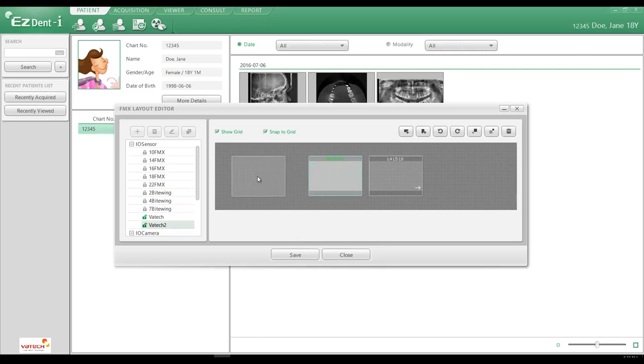From here we can now go ahead and modify this by left clicking and moving these frames to our new location, and then add 2 vertical PAs if we want.